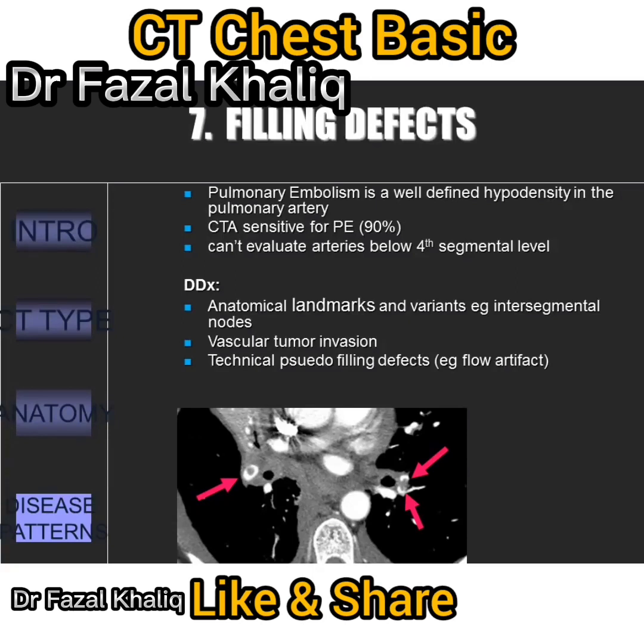Spiral CT is also useful because it can determine the age of the thrombus. Usually, if the thrombus is pushed to one side or is crescenteric, that means it's old and chronic. The CT is also useful to rule out other pathologies which may present similarly clinically to pulmonary embolisms like pneumonia, pneumothorax, or aortic dissection. The sensitivity of CT angio now closely matches the more invasive gold standard of pulmonary angiography. Thus, CT angiography is the diagnostic tool of choice.